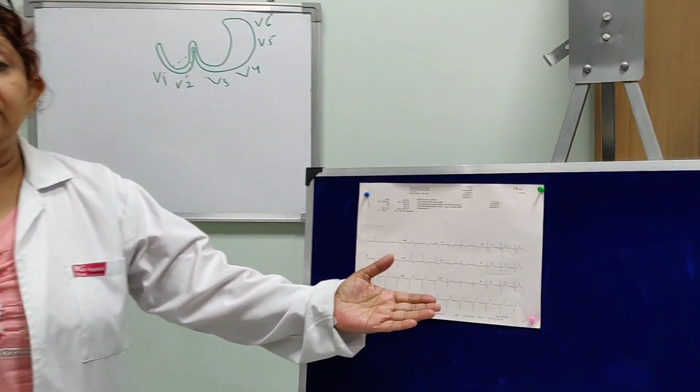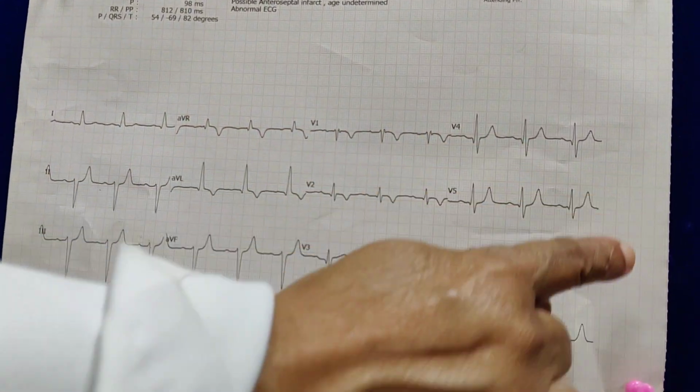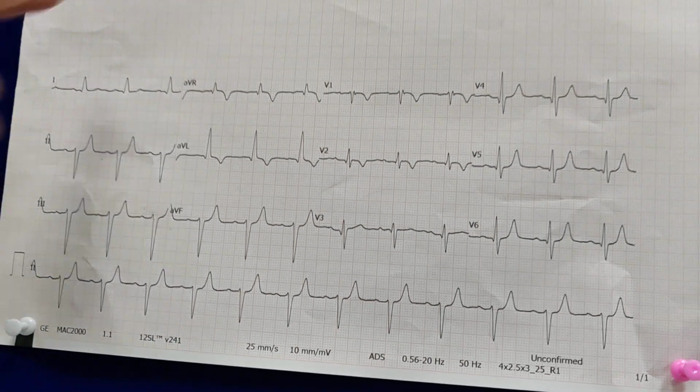So kindly Mr. Negi, please show a close-up of the ECG paper so that we can see all the 12 leads here. No, we should be able to see all the 12 leads.